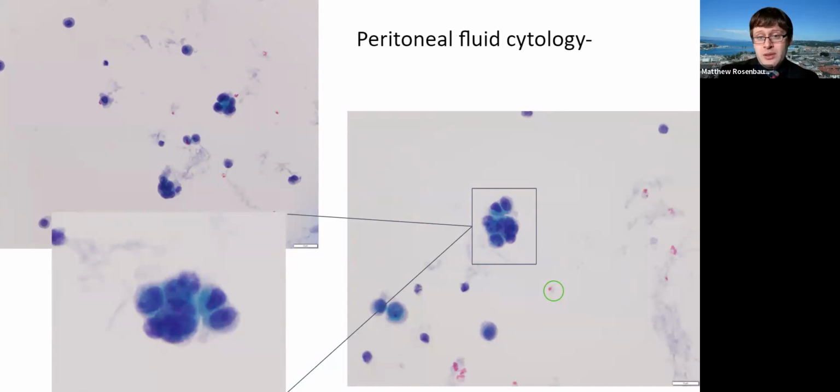As you see, these are extremely large cells, and if you look closely, they have a high NC ratio and very irregular clumpy chromatin. So these are very, very abnormal looking cells, extremely large, with an irregular nuclear membrane and large, irregular clumpy chromatin. They do have decent sized nuclei, although that's not really specific in this manner.